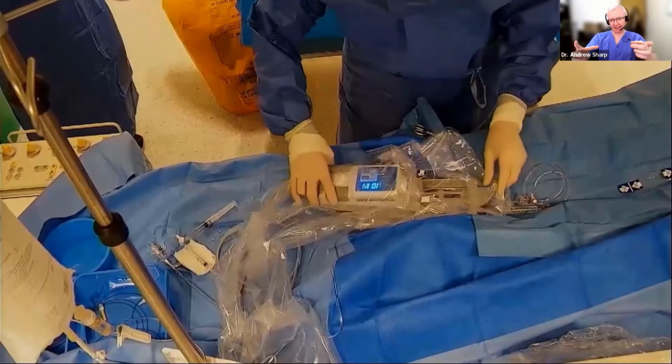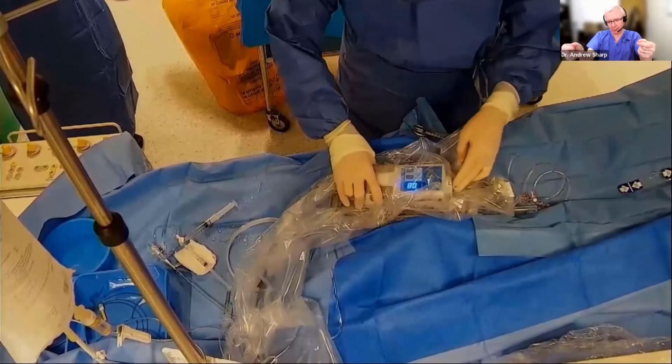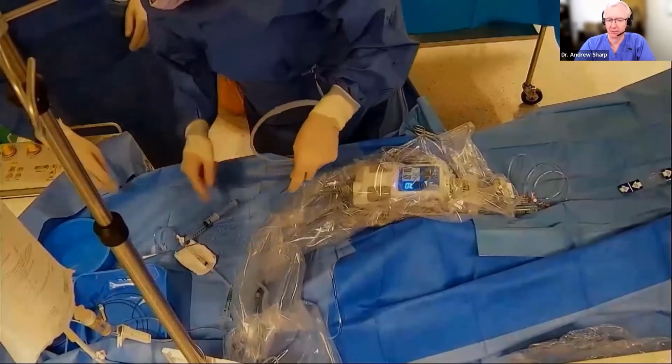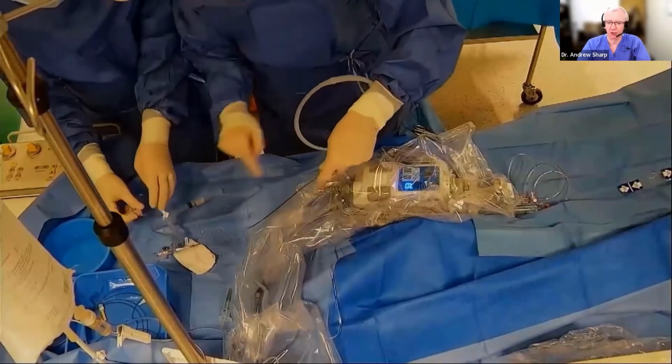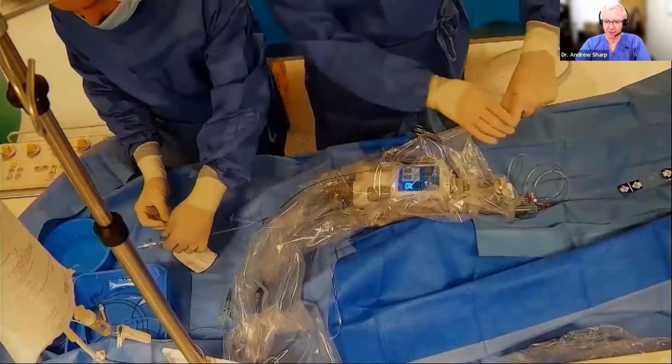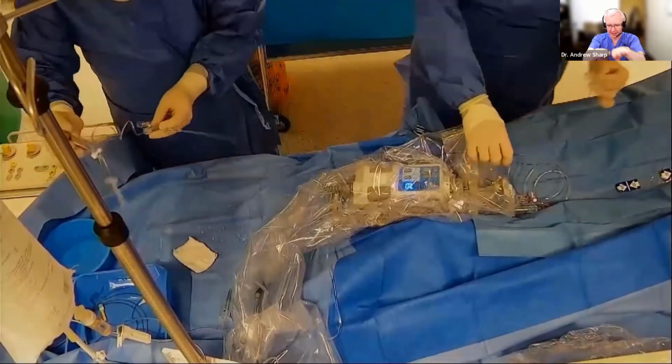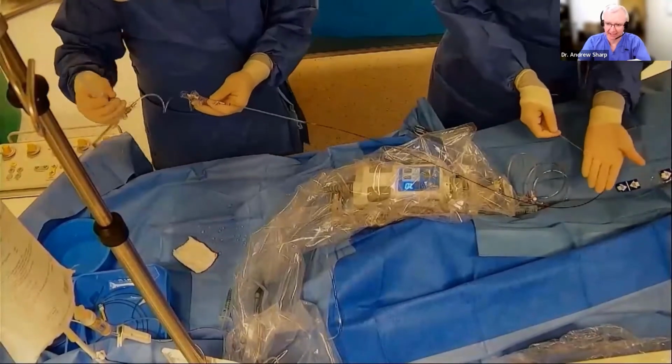If you don't have enough slack, then as the motorized sled pulls back, it gets caught on the amount of plastic sleeve that you have, and it will time out and say there's a machinery error. But it's not a machinery error, it's just detecting resistance. So when you're prepping it, just make sure that in the cradle of the sled, you have lots of slack in the plastic bag.